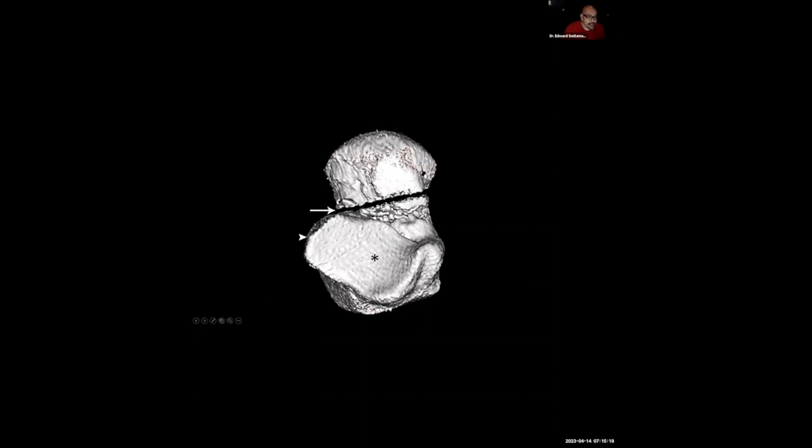So Iannucci actually came along and defined talar neck fractures as those here, typically anterior to the lateral talar process and thus not involving the posterior subtalar joint. So if you have involvement of this posterior subtalar joint, then it's got to be, by definition, according to Iannucci and others, okay, a body fracture. Okay, here in this 3D reformatted CT image, we see that this is a true neck fracture with no involvement or breach of that posterior subtalar joint.